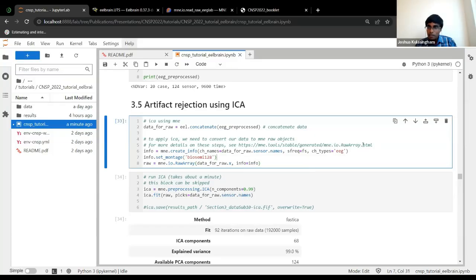So now interpolating, sorry, there's another question about interpolating channels. I'm not sure exactly what you mean by affecting the TRF functions. Oh, so if you leave out channels, does it affect how the TRF is shaped? Oh, okay. Yeah, of course.